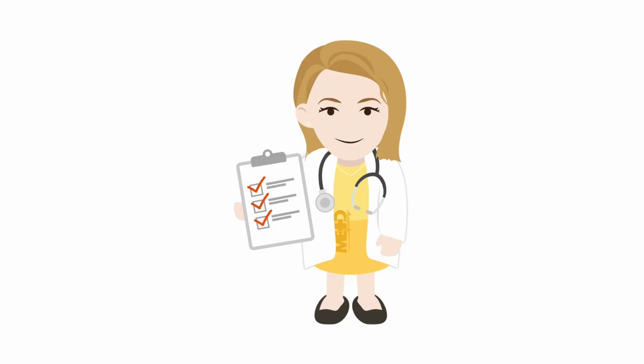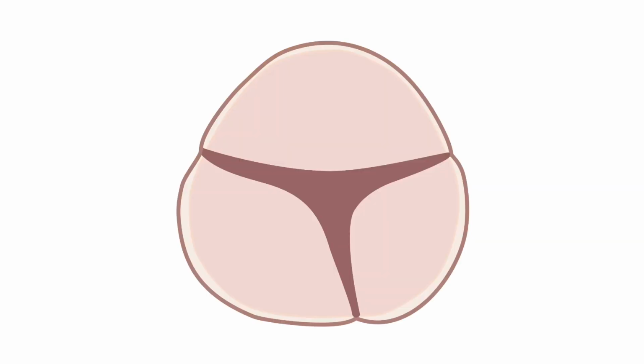At the end of this Med Mastery lesson, you will be able to identify the characteristics that differentiate the tricuspid valve from other cardiac valves. As you know, the tricuspid valve is made up of 3 leaflets. These leaflets are not identical. Instead, they are each a different size.